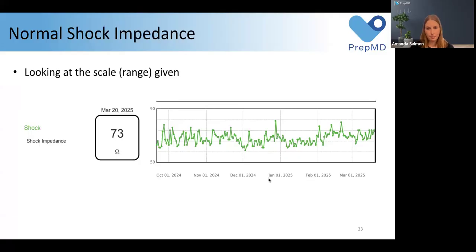at when we're looking at these numbers. Yeah, for sure. So the thing that I wanted to point out on this slide is mostly the range of our trend, our graph that we're getting. If you can see the little arrow, our measurements are between 50 and 90 on this graph. Every device company is a little bit different, and every device that you're looking at, the trends will look a little bit different. If this jumped up, then the range would obviously widen a bunch.